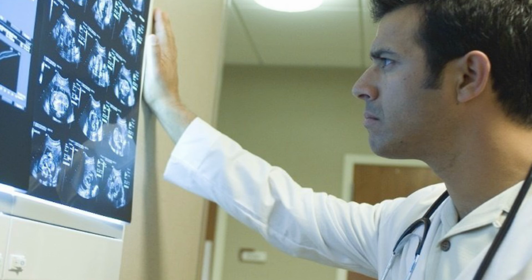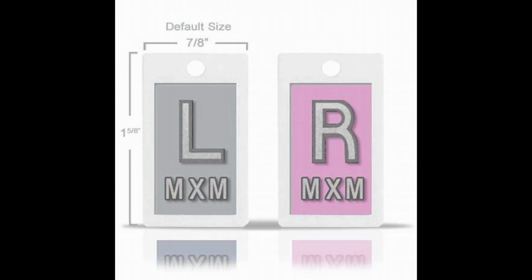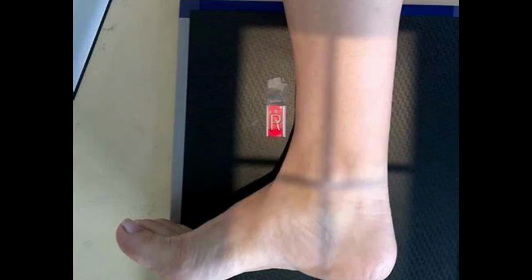It is also absolutely essential that you double-check to make sure that patient information is accurate, since X-rays with incorrect information will need to be redone with the correct information. Markers should be placed along the edge of the primary beam or collimation border. This is generally the ideal placement for markers, since it has the least chance of interfering with the primary image, as the subject of the X-ray should be centered in the frame.